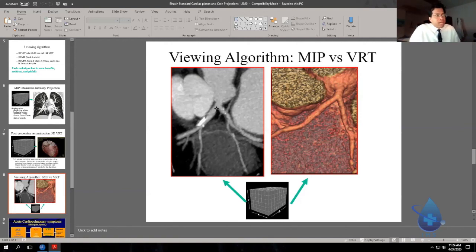So this is the left main bifurcating into the LAD and circumflex. And here we see a vessel coming off the LAD. What vessel is that? First vessel off the LAD? This is the first diag. Okay, so that's D1. There's D2. OM1. OM2. This little wisp guy here is OM1. What's this vessel going backwards? SA. Cool. Yeah, SA. All right. Some guys read the paper. I'm glad. So sinus nodal branch going posteriorly.